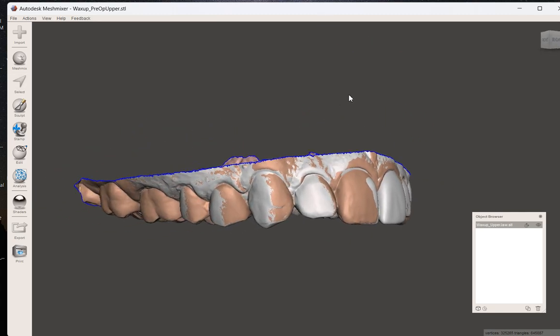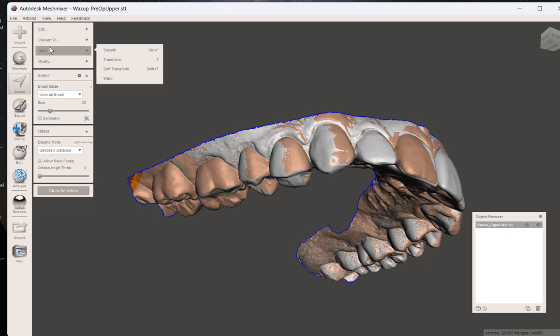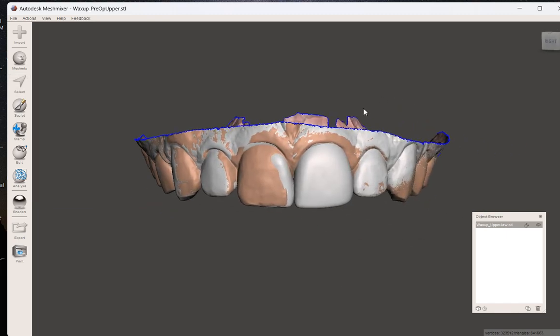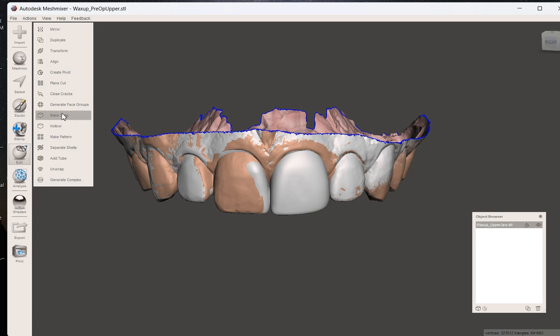Okay, so with this patient here, we're going to make one more little trim. I hate pieces like that hanging out of my 3D printer. I'm going to discard that. And now the quickest and most simple way to make this into a printed model is we click Edit and Make Solid. It's going to take a minute for it to fill all 6 holes of this restoration, but once it does that, we're on our way to getting a 3D print ready model.